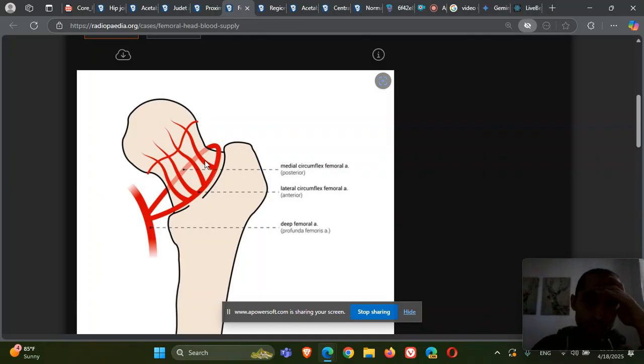Now, as you can see, those come right over here, in the base of the femoral neck. The basicervical region, which is over here, is like the limit. Everything that is intracapsular is right over here until the neck, and this is the reason why intracapsular fractures are more prone to avascular necrosis of the femoral head.